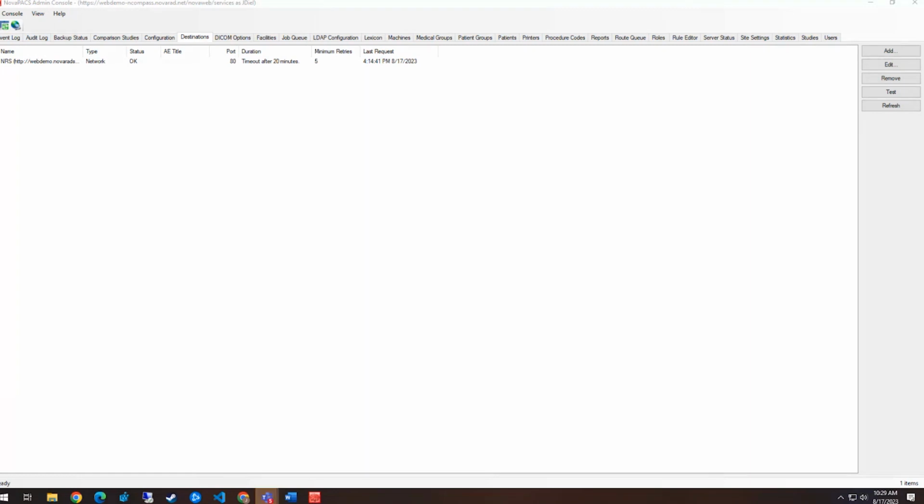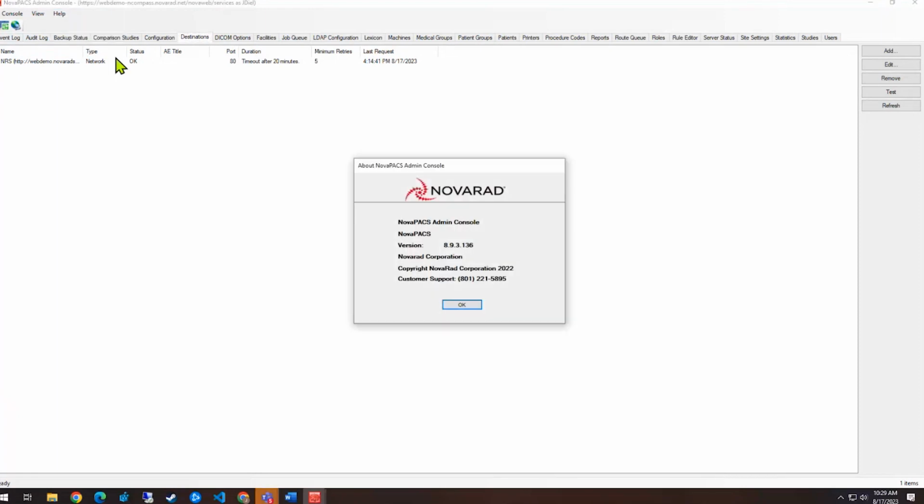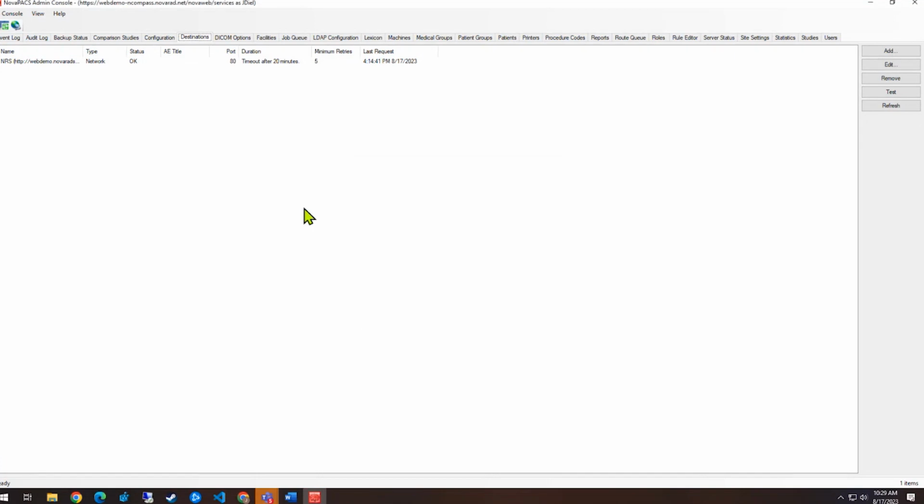You can always check which version you're on. Just come up here to help, and then about, and it'll tell you which version you're currently on. And if you're looking for an upgrade, just go ahead and call into support and let us know, and we'll get a case created and get you taken care of.